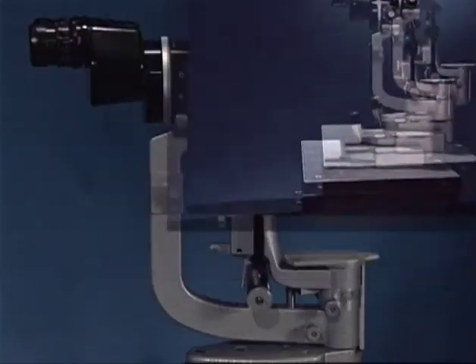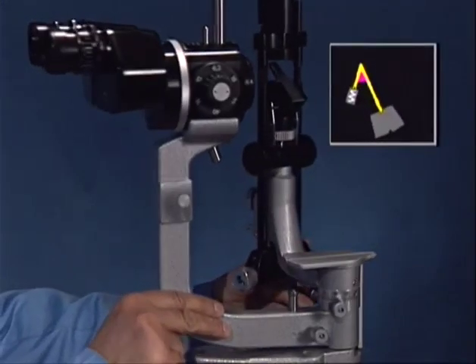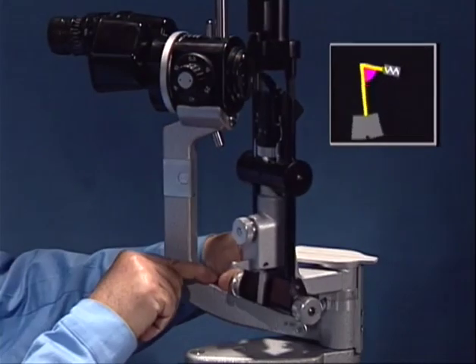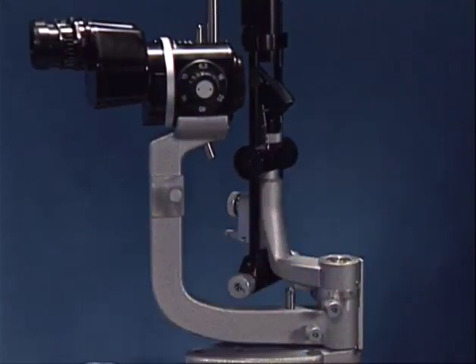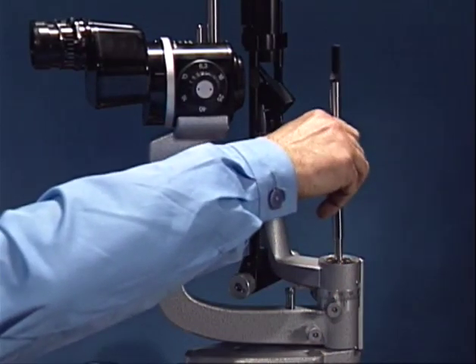The microscope and the illumination unit are joined at the instrument base by a common axis, around which both rotate, so the illumination angle can be increased and reduced. Prior to using the slit lamp, the focus of both microscope and slit beam must be set right at the common axis to establish coincidence of focus.